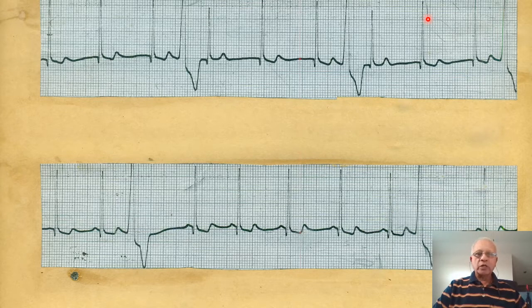Second question will be, what is the difference between the top panel and the bottom panel in the arrhythmia, even though it is the same arrhythmia? What do you think could be the cause of this arrhythmia was my third question. And when does this arrhythmia become important, needing urgent treatment? So, what is the cause of the arrhythmia? What is the difference between these two panels? Right? And when does this arrhythmia become important? So you can start off answering the questions one by one.